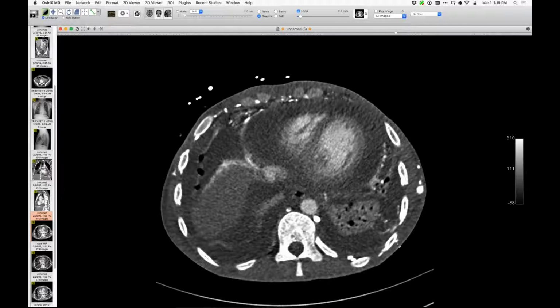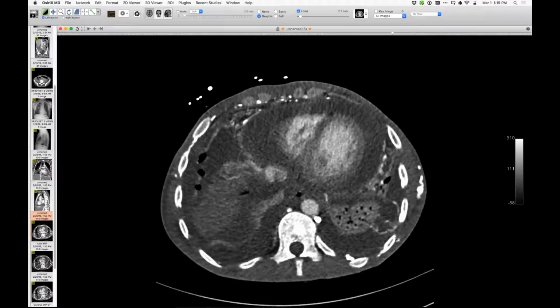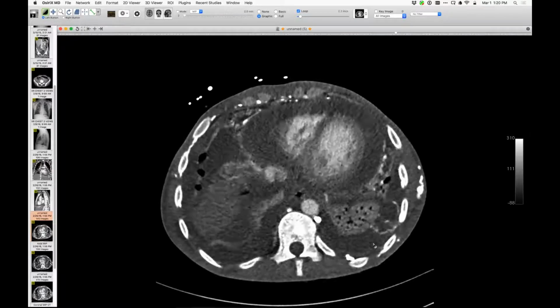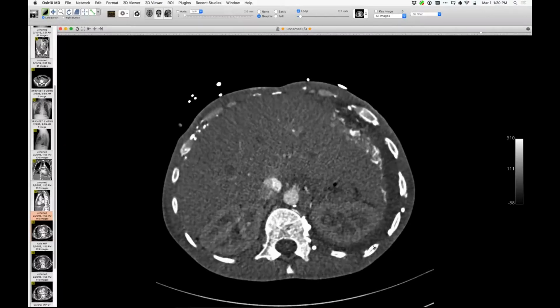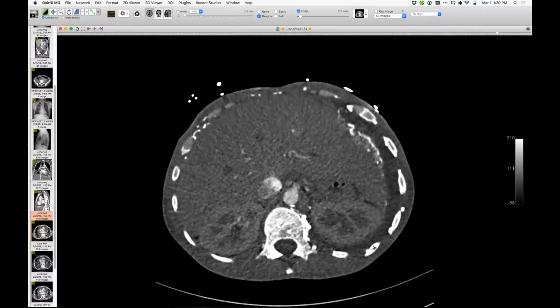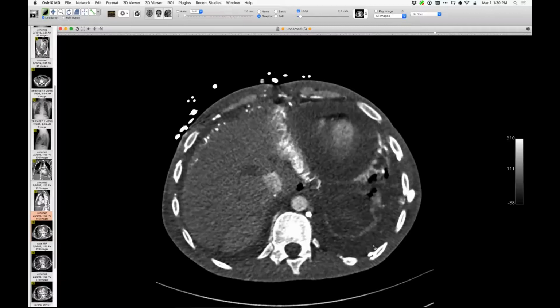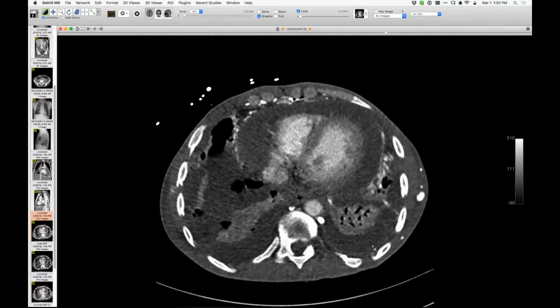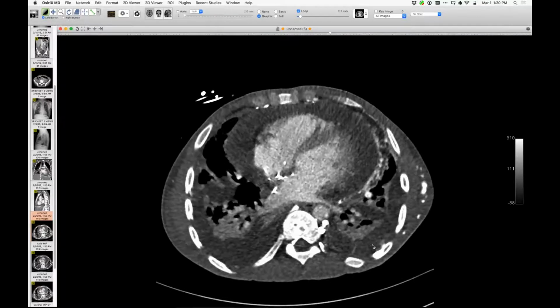My resident says he didn't have the pleural fluid a little while ago. Really? Well, I think he's had time to make collaterals between chest wall veins and the lung. I think we just have a great opportunity to see them traversing the pleural space because now he's got pleural fluid. It strikes me that they're awfully stretched to do that with that lung collapse like that away from the chest wall. Yeah, this is the most dramatic example I've seen of that. I think they just reflect the chronicity of the venous obstruction, in part.